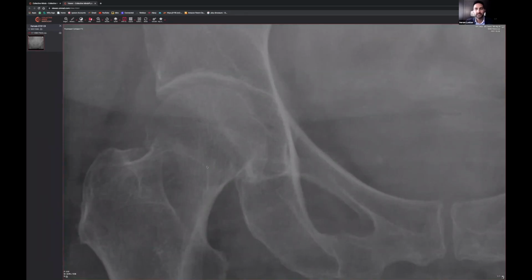Because if you look at the other one, there's nice trabeculations, diagonal lines going across one another. But here, on this particular occasion, you can see that there is an increased sclerotic appearance to this area over here. Yes, you do have some normal trabeculation, but it all seems to culminate to this area over here. And even more importantly, as you come up to this area, you can see that there is a bit of a step deformity there. And this whole area doesn't look quite right, especially when compared to the other side.